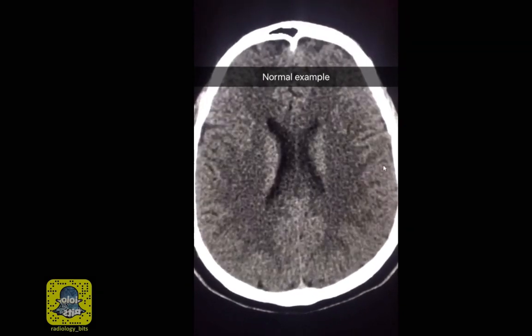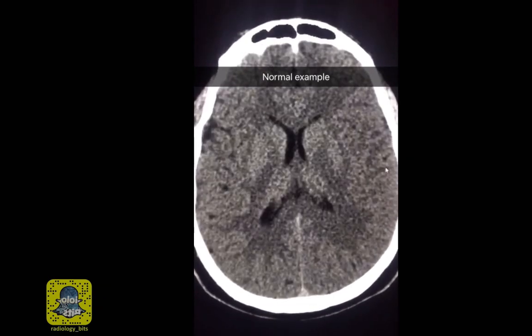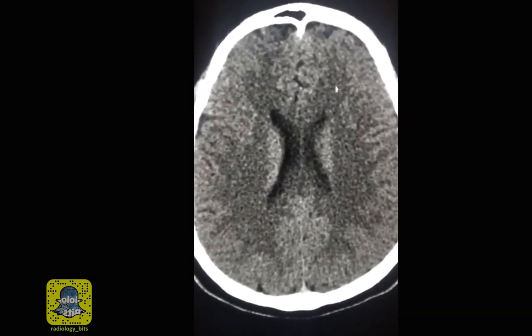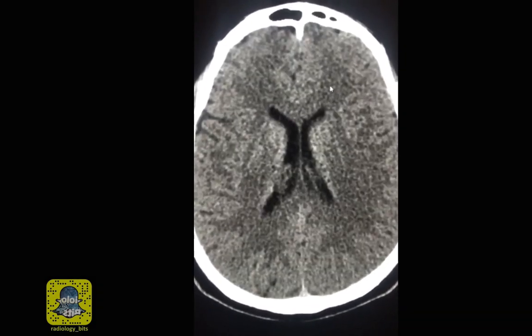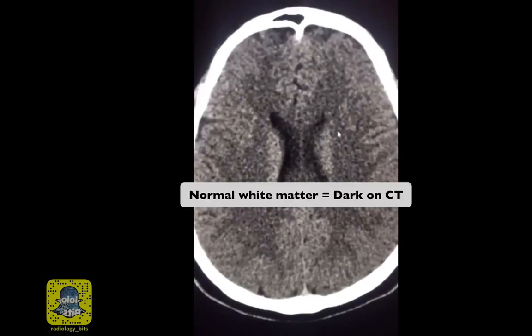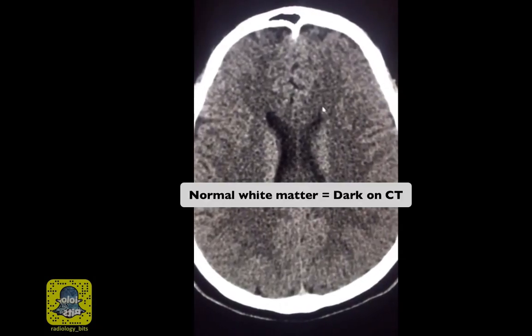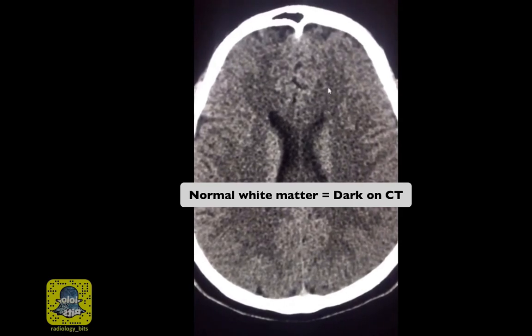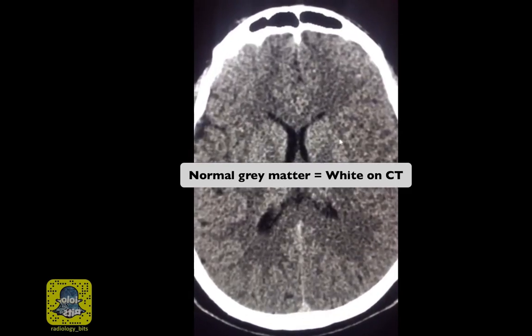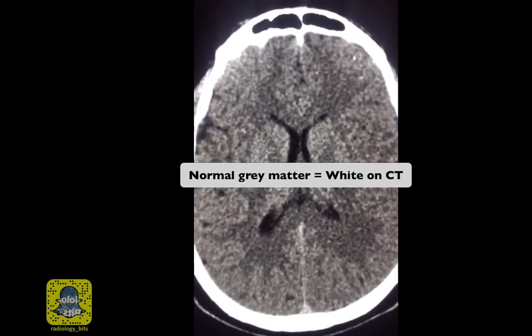This is a normal CT on a different patient. On a normal CT of the brain, you'll notice that you have two different colors. You have this dark area compared to this brighter area outside. Opposite to what is expected, on a normal CT, the myelinated white matter, which is deep, appears dark, while the gray matter appears bright.